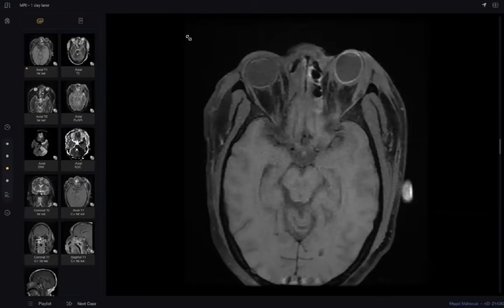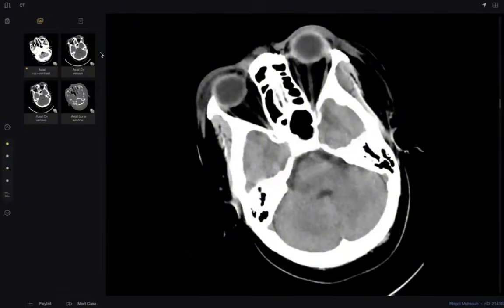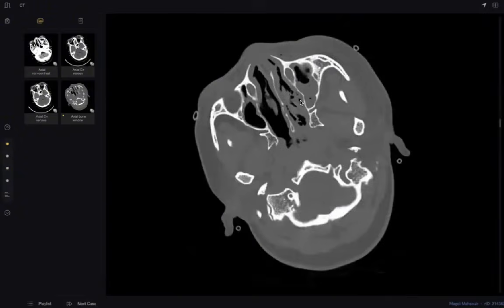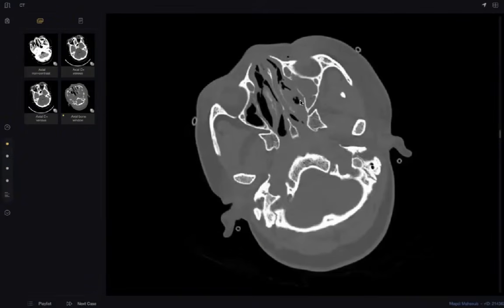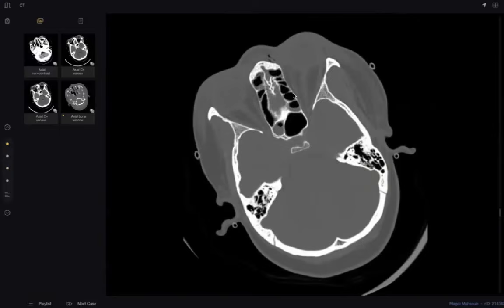Here in this patient, why was the patient complicated and the doctors couldn't save him? Because in the first CT, I think this fracture was missed. Besides, there are some very subtle findings. If you look here, there is very subtle fat smudging. Can you see it or not?